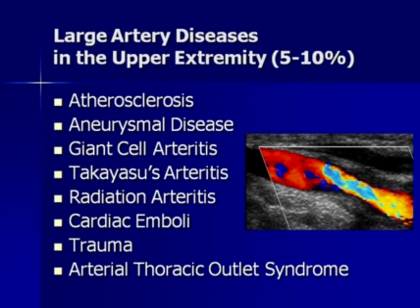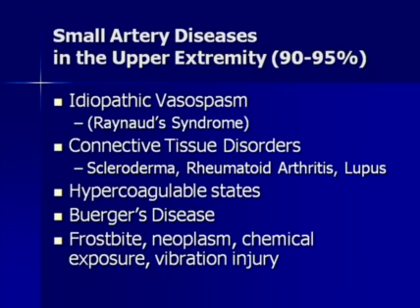In this figure over here, we see a vessel. This actually happens to be a common carotid artery, and we can see this diffuse buildup in the wall here, and that's very typical of a patient with arteritis. We'll come back to that in a second.